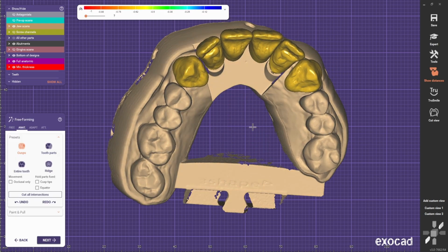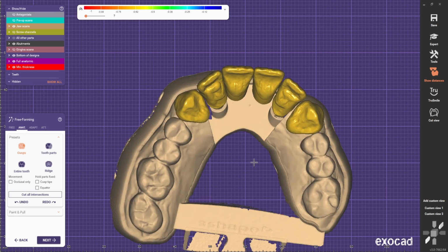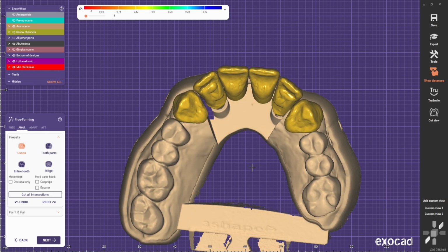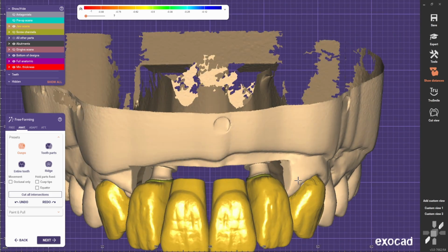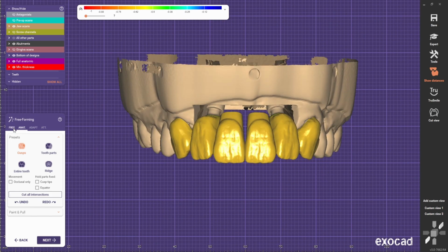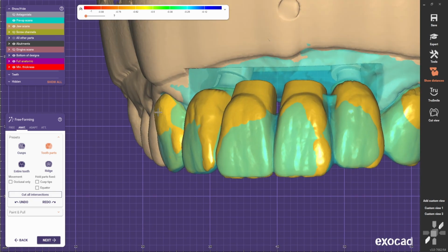So we have placed the teeth and we adapted them to the preps and to the abutments, and now I'll just sort out the shapes because, as you can tell, they are a bit distorted in these areas. Always taking into consideration the shapes of the pre-op.